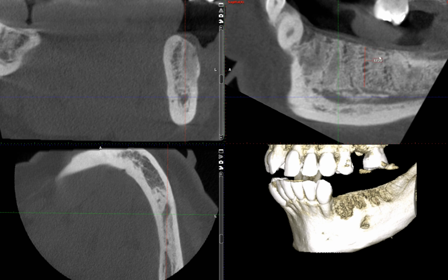So that's about 12.2 versus 15.8. That's almost 16 millimeter, a difference of 3.6 millimeter, right? So almost 4 millimeter of difference, and that's pretty drastic, right? If you measure the ridge height to be closer to 16 millimeter, that means you can give yourself 2 millimeters of safety margin, which means you can use a 13.8 length implant or something shorter, whereas now with this measurement, you want to stay with an implant that's 10.2 millimeter or shorter. So that's a rather drastic difference that you want to be mindful of when you're planning a treatment implant.